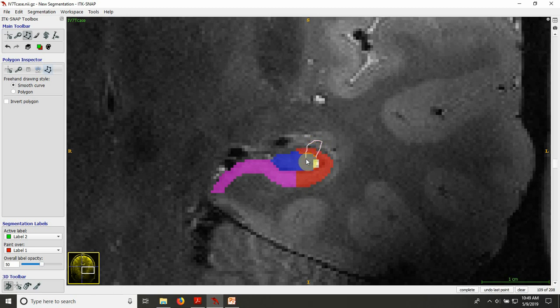And then I'm going to circle back. And I'm actually not sure about this medial border of CA2. I'm just going to place it in this location, but I'm going to adapt it at a later point. So this would be more or less my CA2 region. And again, the CA2, CA1 border is correct, and I'm adapting this border later.